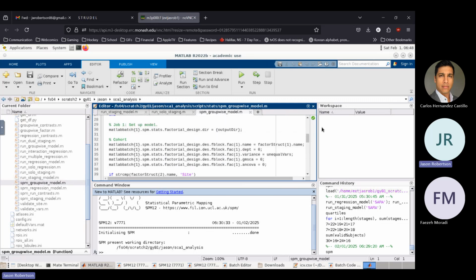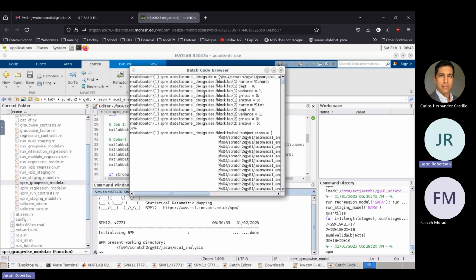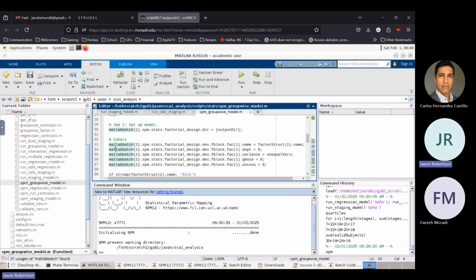So these lines here are literally the same as these 5 lines here. Copied directly over. The only thing different is that I'm specifying it with a variable instead of with a hard-coded name. And same deal as you scroll down.